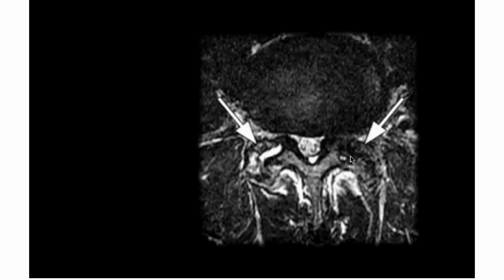What is there? Can you see the facet joint here? Can't see, no? Let's stop it. Because of the severe degeneration of the joint. So the same patient, same level, on one side we have inflammation, on the other side we have degeneration.